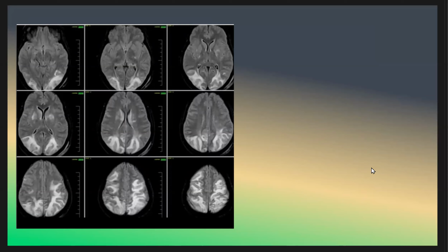This patient is 32 years old, postpartum. What do you think the patient has?